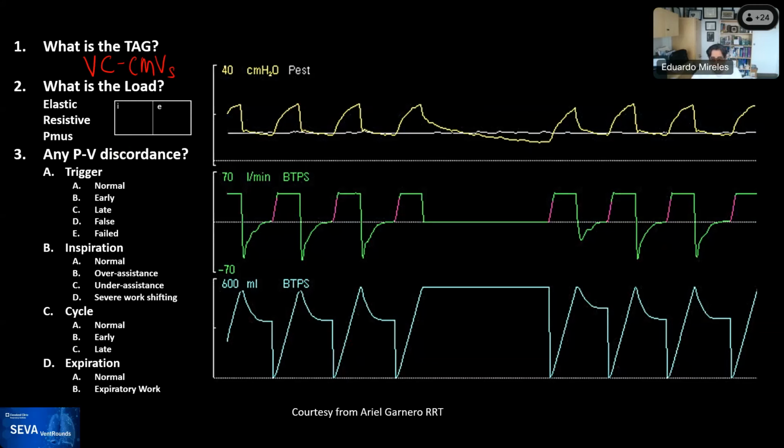You're just seeing whatever was left in the lung returning into the ET tube. And so that would not be affected by the leak. You would see how it returns back to baseline. Now, if it's a massive leak, you may not see any flow coming back because all of it is leaking outside of the system. So great question.